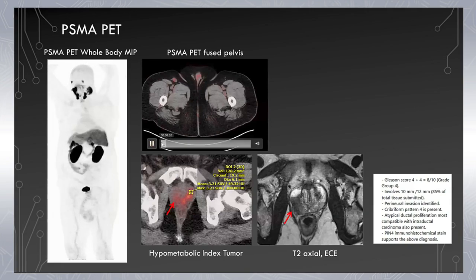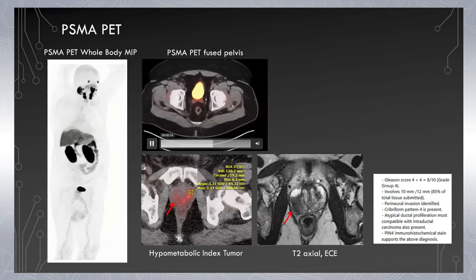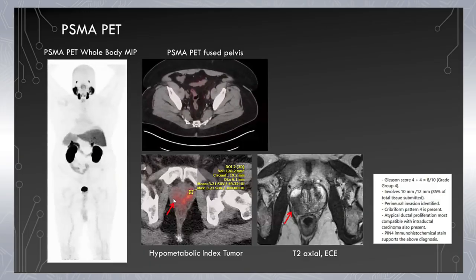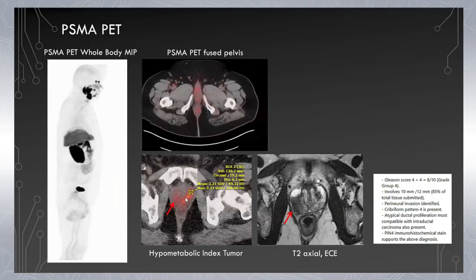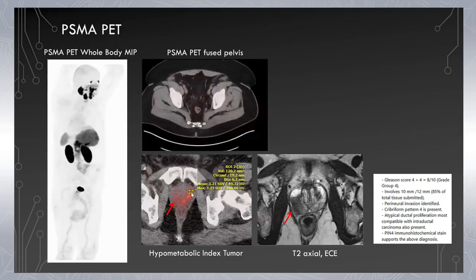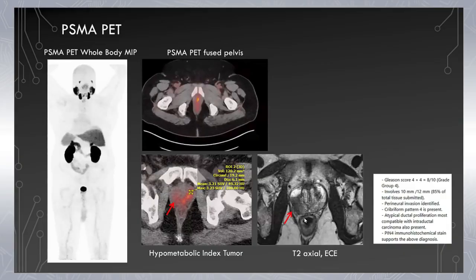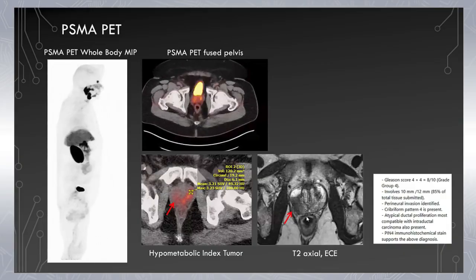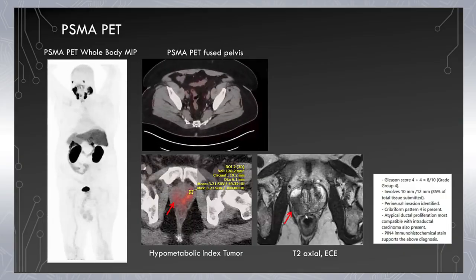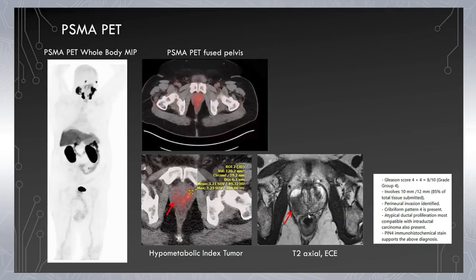Let's look at this patient's PSMA PET. So in the same area that correlates with the patient's high-grade volume of disease, we see very little uptake. In fact, it's clearly less than what we see in normal physiologic prostate. Putting an SUV, 3.21, but clearly less than that. And this correlates unquestionably with the area of abnormal T2 axial, abnormal signal on DWI and on T2 weighted imaging, and in an area that demonstrated extracapsular extension.